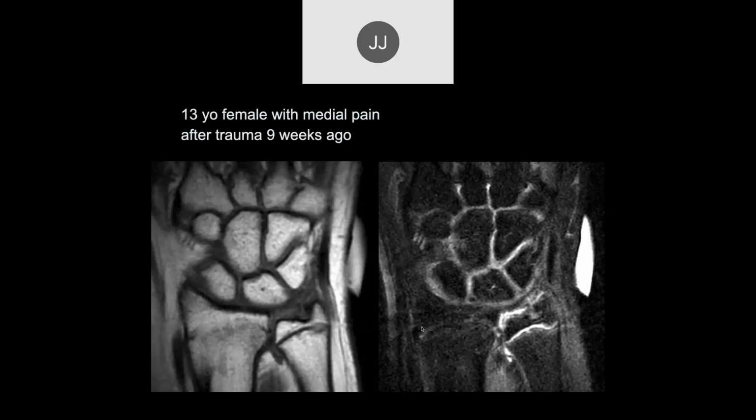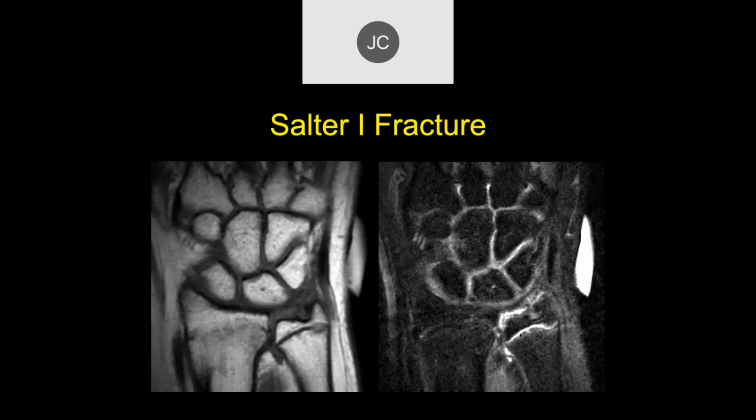All right. So we have a 13-year-old with medial pain after trauma 9 weeks ago. Looks like there's a little bit of a DRUJ effusion. Looking at the ulna, there's an increased signal in that physis. Yeah. Again, this is another Salter one.